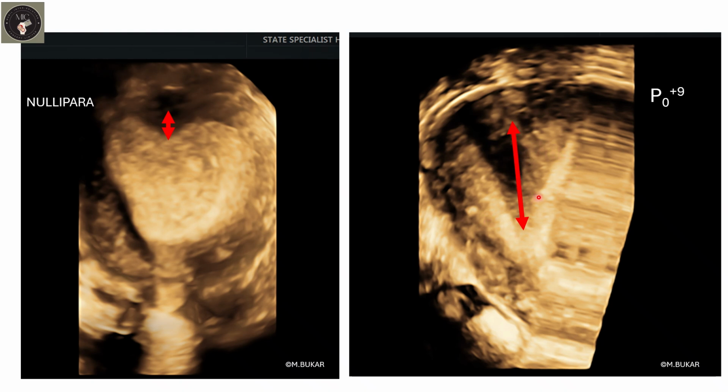HSG diagnosed this as a bicornuate uterus, but on 3D, one can see that the fundal contour is normal. So this is subseptate uterus and not a bicornuate uterus. Luckily, this patient is being planned for hysteroscopic resection of the septum. Again, normal fundal contour, normal fundal contour. In bicornuate uterus, this fundus will not be normal. Remember, the only two conditions that can give abnormal fundal contour are bicornuate uterus and uterine didelphys. Thank you very much for listening.